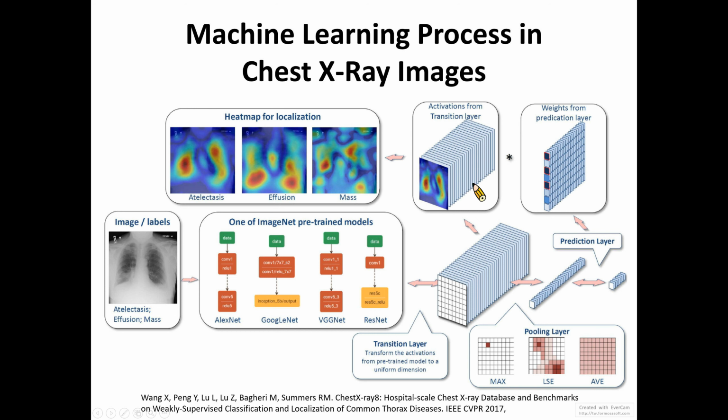I will illustrate this platform later, but let me just show you the layout of our platform. You can just drag any images onto this platform.